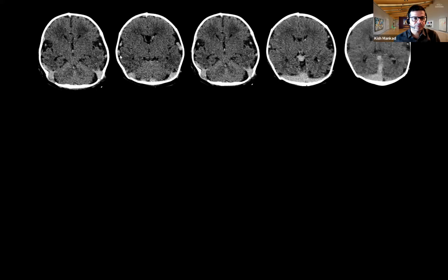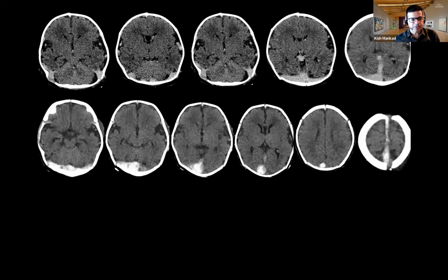Is this a situation of an extreme pan venous sinus thrombosis or venous thrombosis in the brain, or is this something else? And whilst you are still thinking, this was also labeled initially as physiological, but the problem we have is that these are indeed thrombosed. And as time progresses, we start seeing very convex, large, expanded, rounded sinuses.